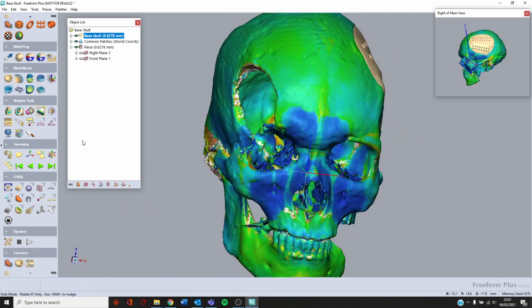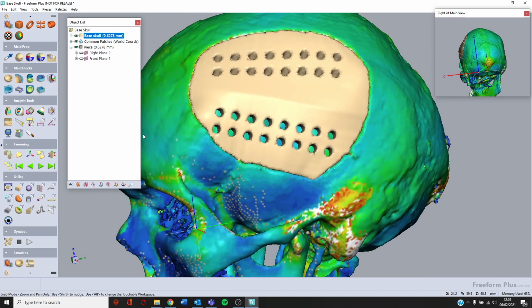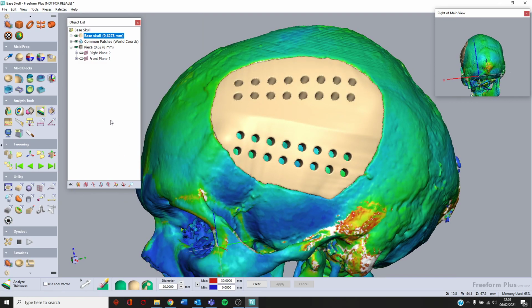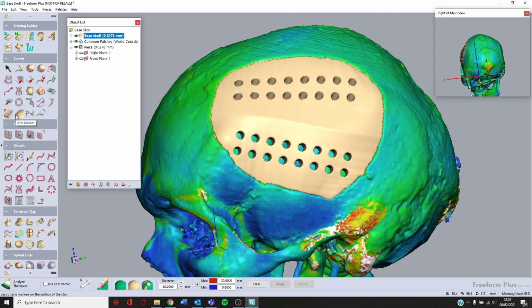So that's a really handy tool because it does allow you to plan a little bit better, obviously with the patient geometry in mind. So how can we utilize it? We can, for example, use our axis markers. If I go into that, I'll use the default one for the sake of this exercise. So you've got the diameter of 10 millimeters, clearance 5. Maybe I'll just change length, it's always good to have it bigger. And the alignment mode is surface normal. I've got my haptic bump, great.